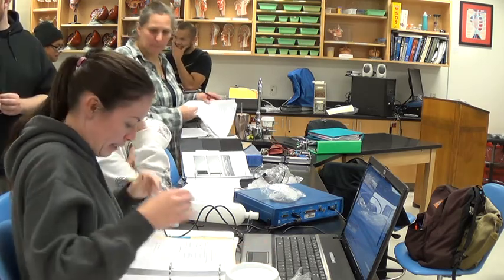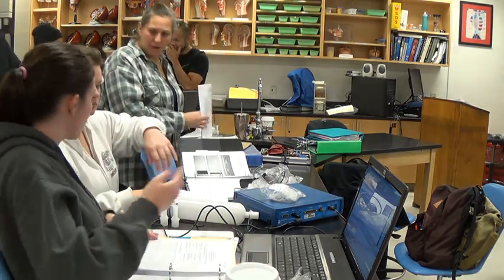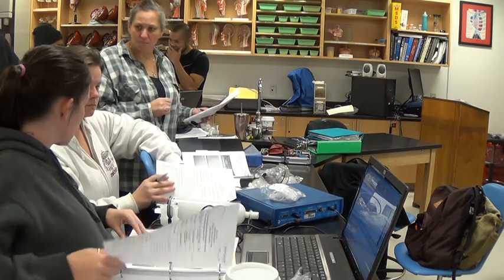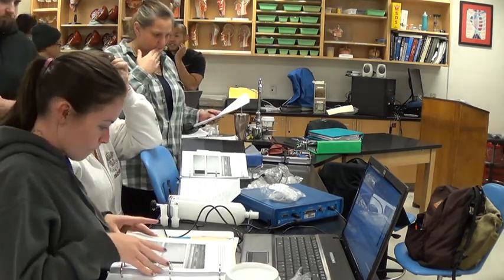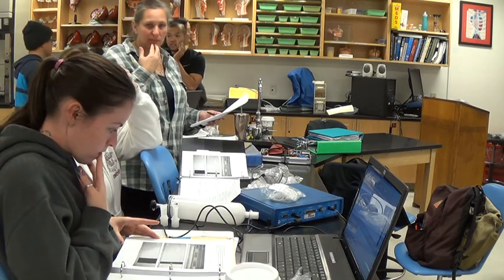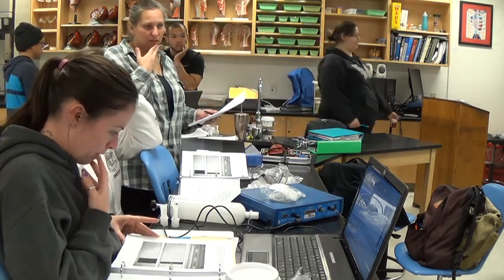No, that's just for the mouthpieces. Put it away, don't touch the mouthpieces, and it should go in the red trash can, because they've had your spit on them. I know, you blow your nose and put it in the trash can, but this is a biology lab.